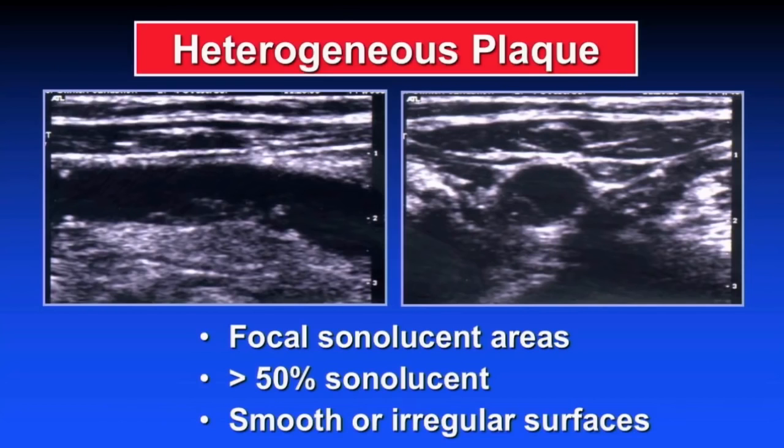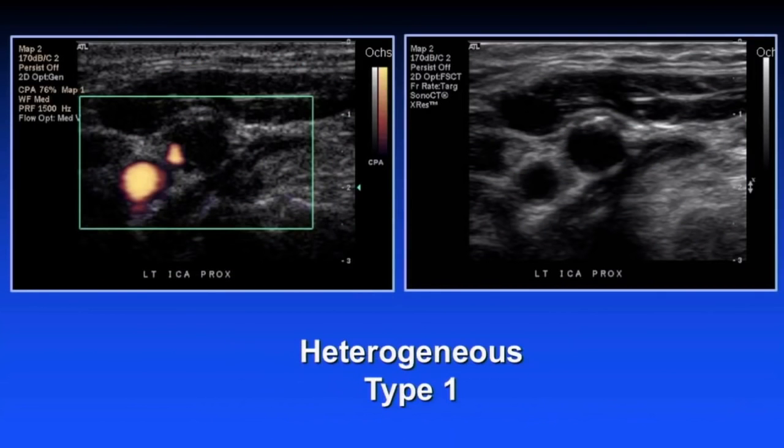You just want to understand the big issue: heterogeneous, homogeneous. Again, let's look at some better, more recent examples. This is a color image showing the internal and external carotid artery, which helps us determine that this is the residual lumen, so this represents all the plaque volume. And you really need to characterize the plaque on the grayscale only. You can't characterize plaque in color or power imaging.